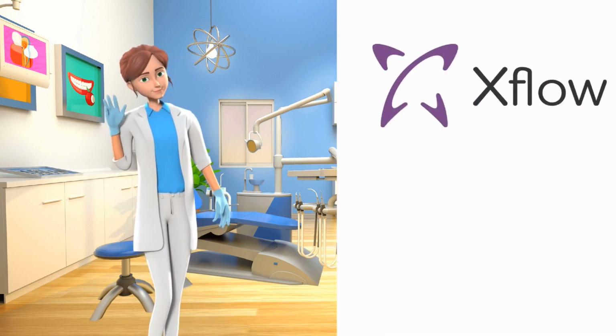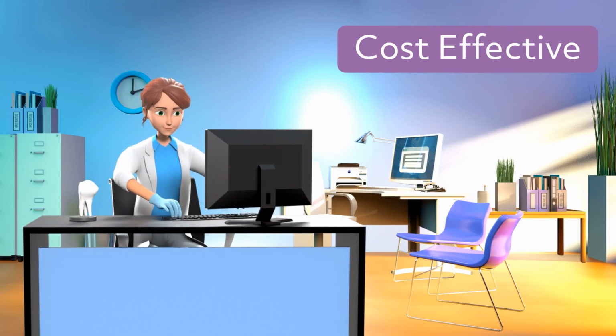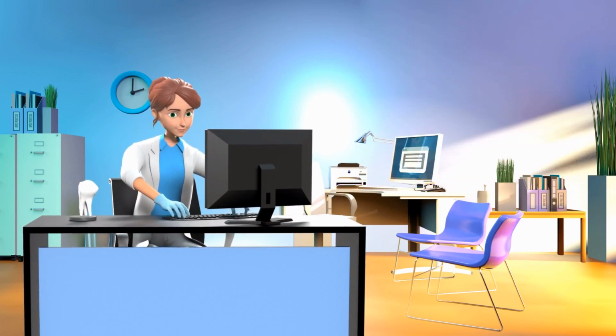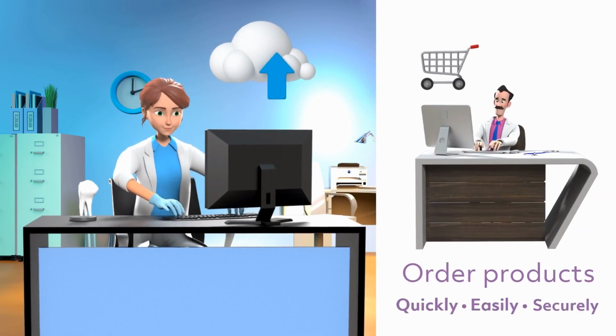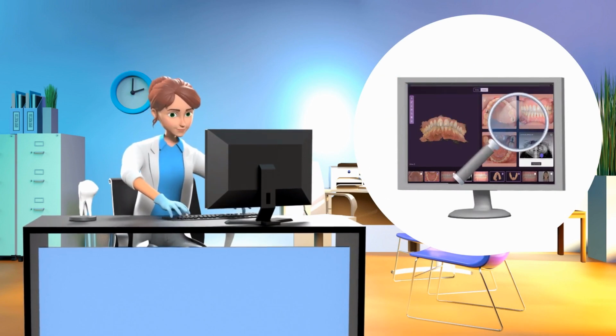Welcome to the Dental Access platform Xflow. Xflow provides for cost-effective, convenient, and compliant data management in the cloud, meaning you can store case data and order products quickly, easily, and securely. I'll show you around the features and how to get the best out of your data.